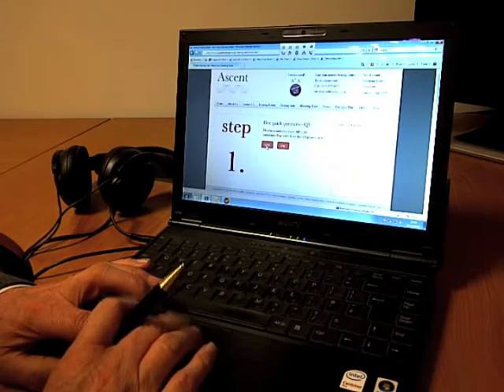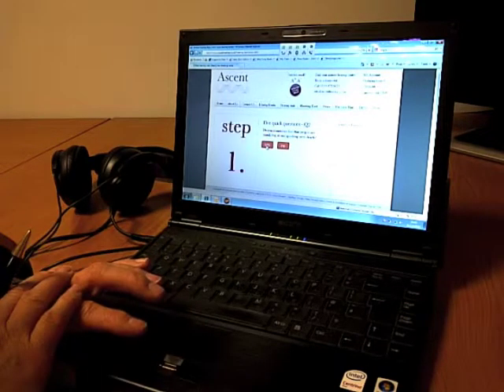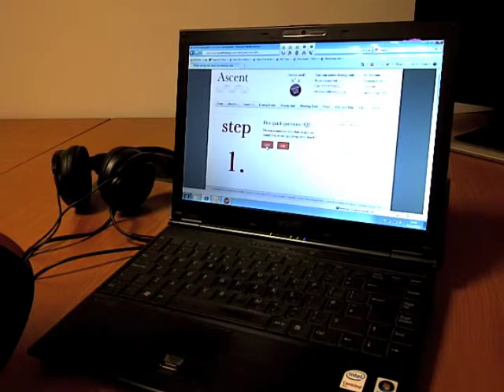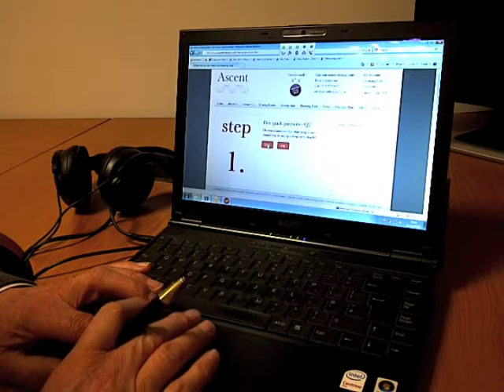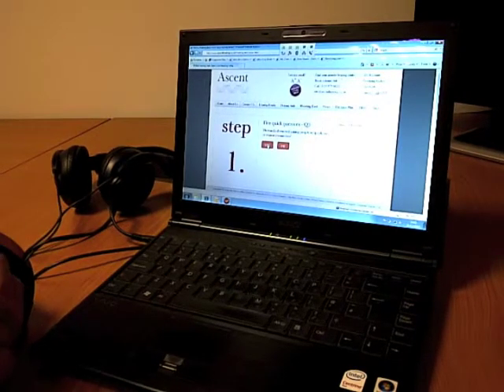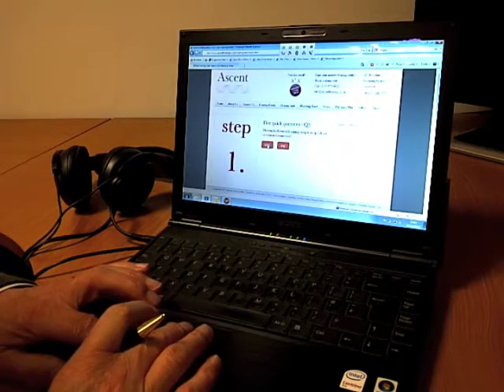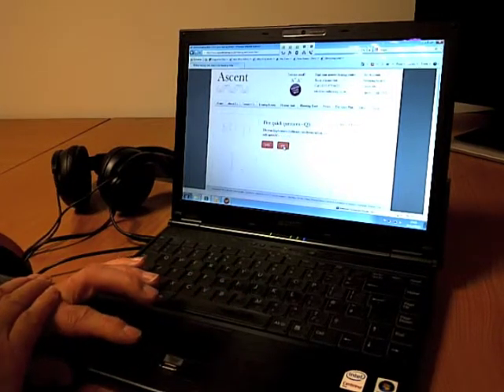So I'll click yes, because I do sometimes have problems on the phone. The next question that it's asking me is, sometimes do I feel that people are mumbling and not speaking very clearly? So rather than it being my hearing that's to blame, I'm blaming other people. And again, click yes or no. So I'll click yes. Third question, do I find myself asking people to speak up or repeat themselves? Does that ring a bell? If it does, click yes. If it doesn't, click no. Well, in this case, I don't actually recall having that problem, so I'm going to click no.